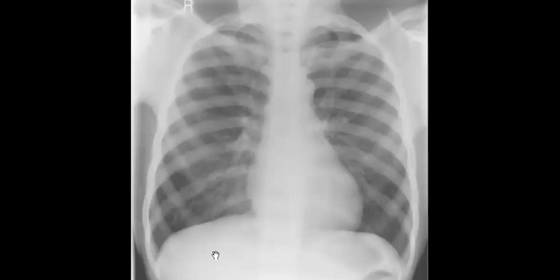Yes, so perfect. So here we can mention that there is maybe increased bone density and there is central depression, which is very subtle, but maybe if you try to trace it, you can find it, and at least you can search for it.